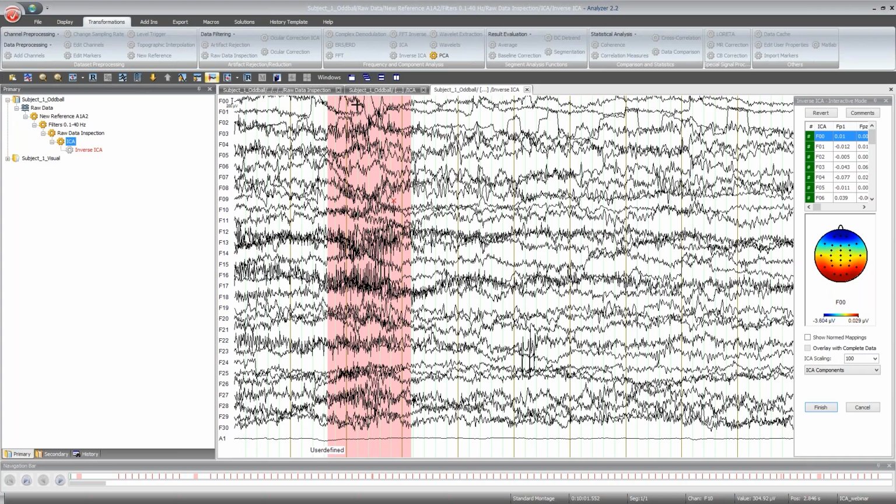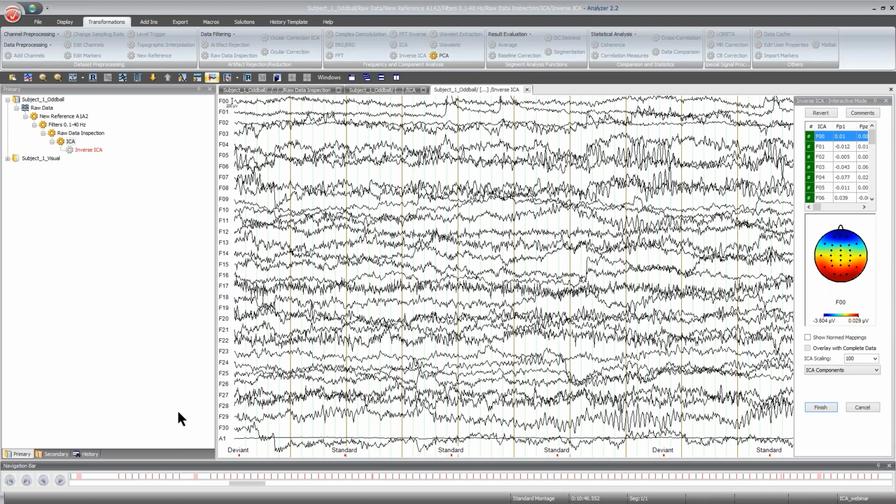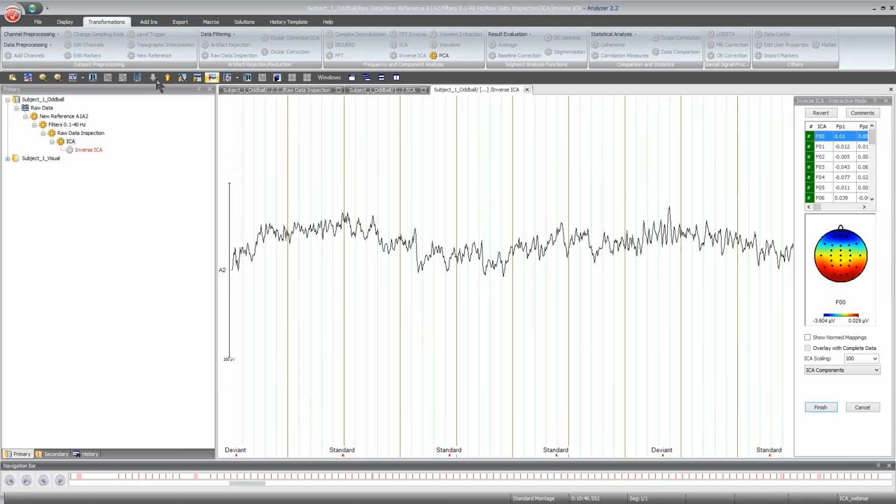First of all, we have the time courses here, and we can skip through the time courses, as we know. Make sure to always check in the beginning, like I said already, what is shown here. We have the components starting with an F, and then if you have any channels, like I do here now, that you did not include in the ICA, they will come at the bottom afterwards. So the A2 is actually on the next page.